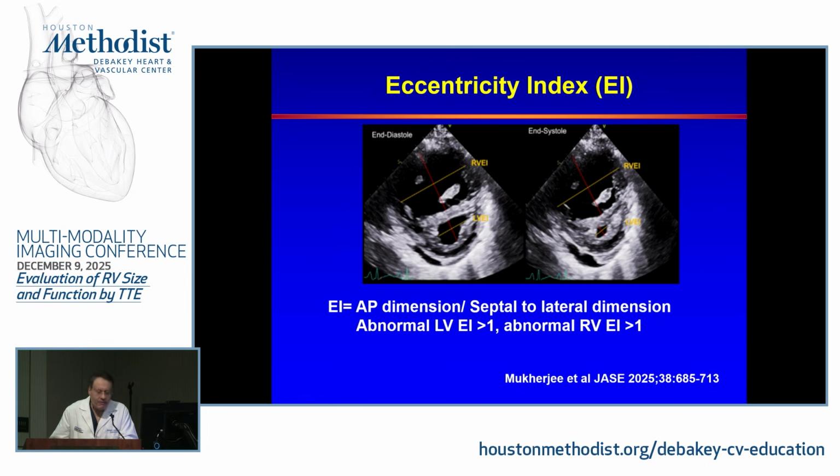If you see a septum that is flat in diastole but not systole, this is volume overload. If you see a septum that is flat in systole, this is pressure overload. A septum that is flat in both systole and diastole is pressure overload with or without volume overload.